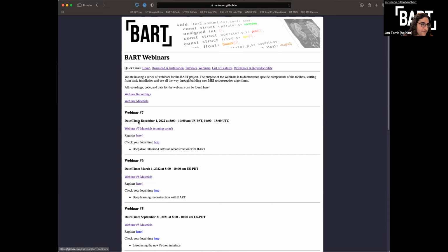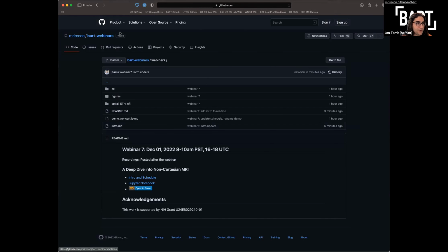Under webinars, we have all of the webinars so far, including webinar 7. This takes me to the GitHub, where Moritz and Christian will be presenting from. So we have here essentially the schedule and links to the notebook and to Colab for webinar 7.